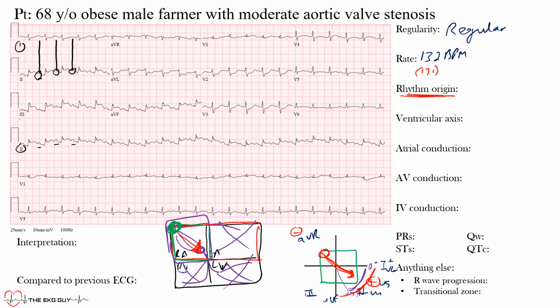If you look at lead 3, same thing here. Okay, so upright P waves, but notice lead 3 is over here, so you may not always see it here. All right, and then we wanted to look over, and here's AVF. You can see upright P waves there. Over in these lateral leads, here's a P wave in V4, V5, and V6, and then AVR, which is this lead here. So if you look straight up, you can see that these P waves here are negative. Okay, so what this indicates is sinus rhythm is present.